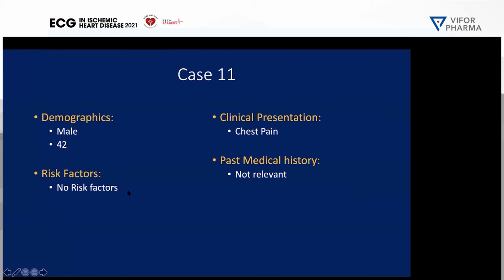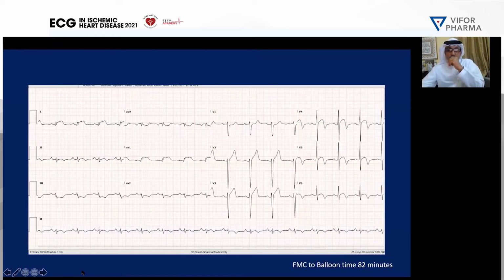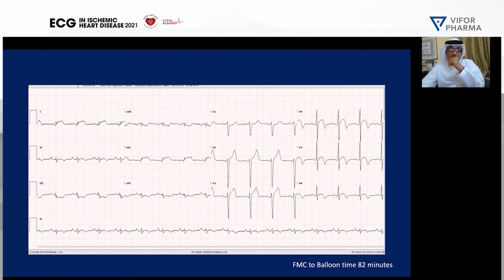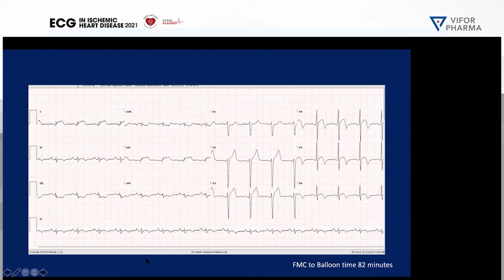Now we reduce the age, now 42. So a young patient with chest pain. We did an ECG, and that's his ECG. Again, rate, rhythm, axis, interval. The rate is around 3 big squares. The rhythm looks sinus: P, QRS complex, T. The axis looks normal. The intervals also look normal: the PR interval, the QT interval, and the QRS complex.